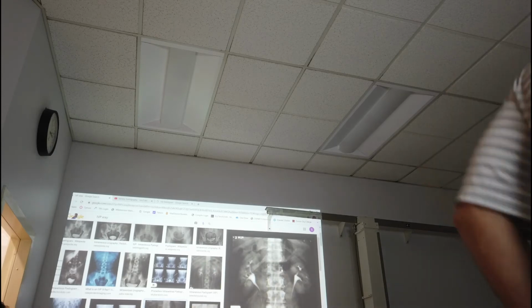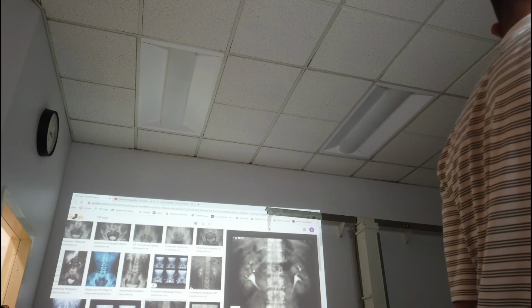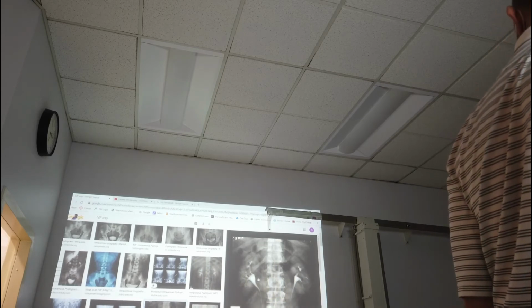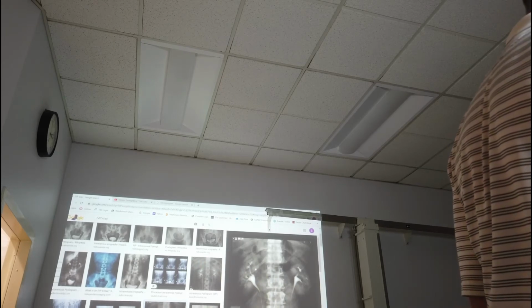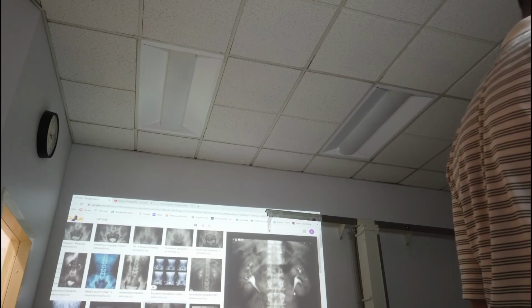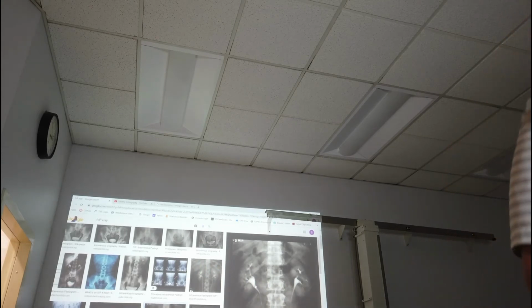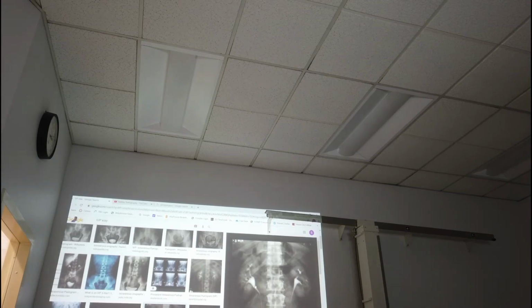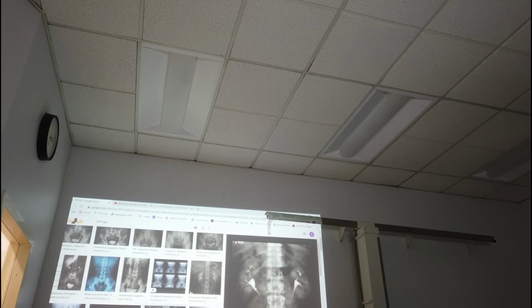And this portion of the kidney, this area right in here, is called the hilum. Just like the lungs have a hilum, there's a hilum of the kidneys too. The hilum is where the blood vessels go into the kidneys. But this medial portion of the kidney and this medial portion of the kidney right here, you can see it's kind of resting. It looks like it's touching the psoas muscles, almost like using them like pillows. And the reason they sit like this is because the middle portion of the kidneys are resting on the psoas muscles. So that's what's causing them to do this.